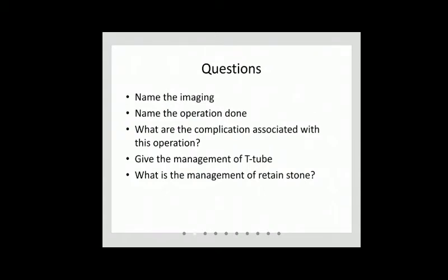It is a T-tube cholangiogram. T-tube cholangiogram. Okay, thank you. So T-tube cholangiogram, and the operation is the choledochotomy or choledocholithotomy for CBD stone, common bile duct stone.